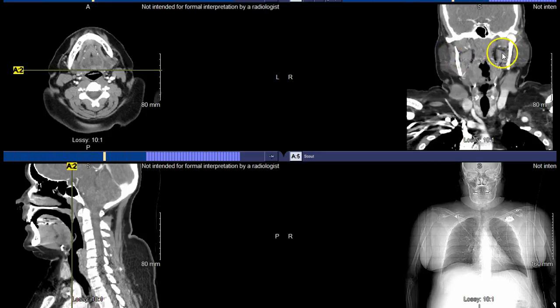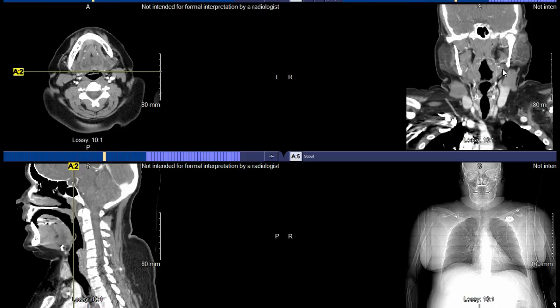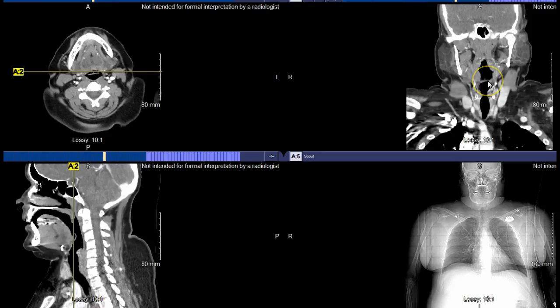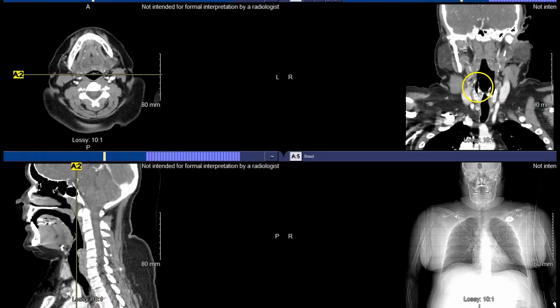You can see the structures of the mandible, which you've learned and should know at this point. But what does the epiglottis really look like? We can see where the epiglottis is. We can see very clearly where the piriform sinus is. We can see that aryepiglottic fold going more vertical there and there. Then we also can see some of that vasculature.